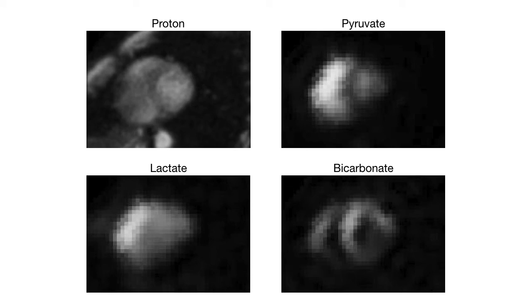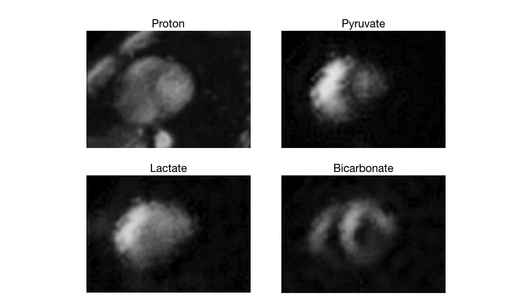Here are more results in the heart. Here I'm showing the pyruvate, lactate, and bicarbonate. And here's after the interpolation. Before, after.